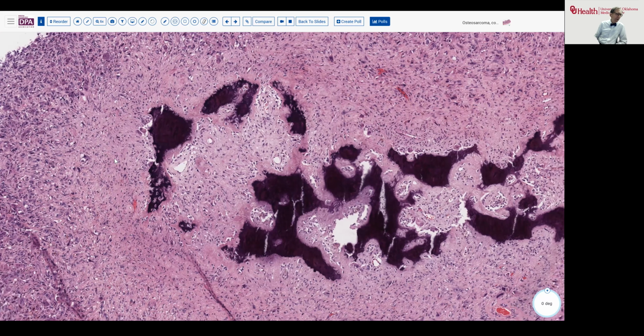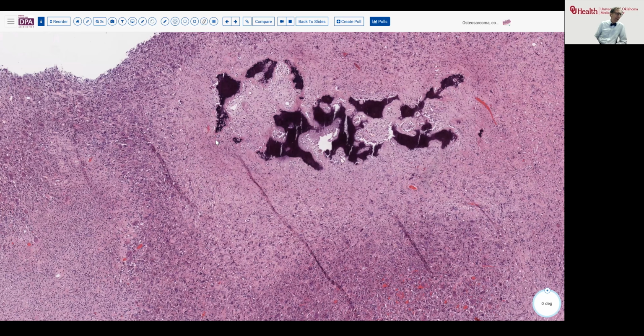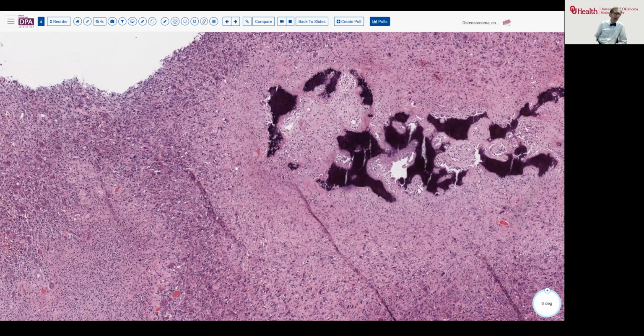And very often in these complicated pathologic fracture tumor cases, you may get this constellation of findings. And so you have to resist calling this the osteoid as in osteosarcoma, and rely on finding definite osteoid within the tumor cell areas proper, and appropriately interpret this reactive bone.